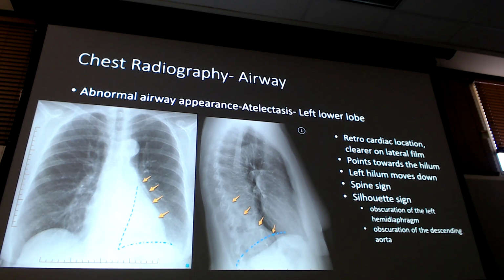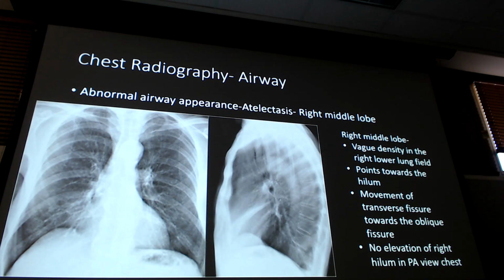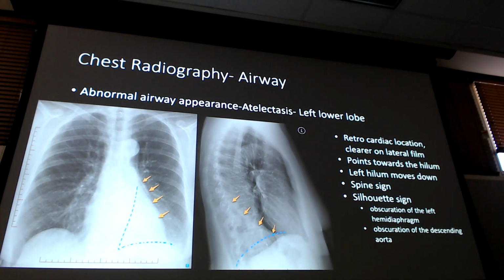Left lower lobe, spine sign, silhouette sign, pulling the fissure down a little bit. Yes, no, maybe. I know. Here's one in the right middle. Yeah, okay, right.